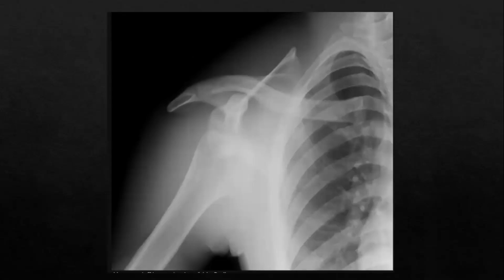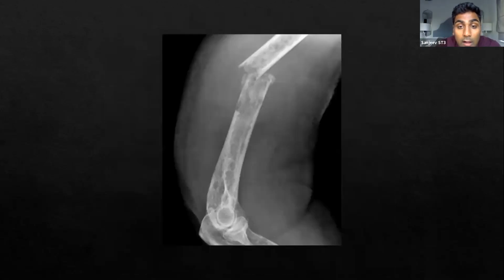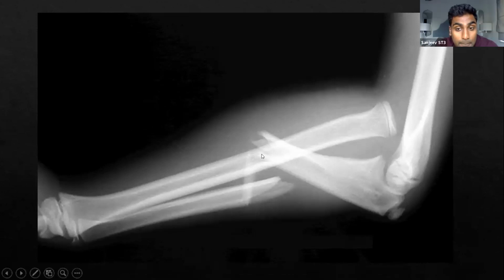Great. We just had one quick question on the elbow. No problem, yeah. On the elbow fracture, the Gillespie one. It's just asking if the olecranon is fragmented too there. Oh, yeah, so this is a really important point. So do you see, that olecranon, yeah, there is a line going through there, but you see there's also lines going through here in the distal humerus, here through the radius, here through the distal radius as well.